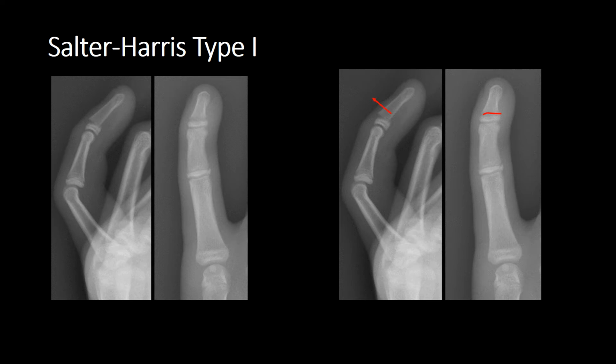On the DP view, if you look at the physis of the intermediate phalanx, the physis of the proximal phalanx and of the metacarpal head, you can see that it's uniform, a normal, quite thin physeal plate. But once you look at the physis of the distal phalanx, you can see that there's real diastasis there, indicating that there's been disruption.